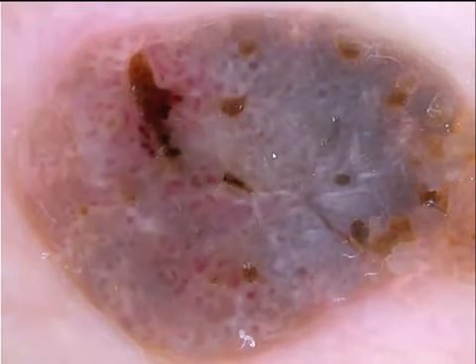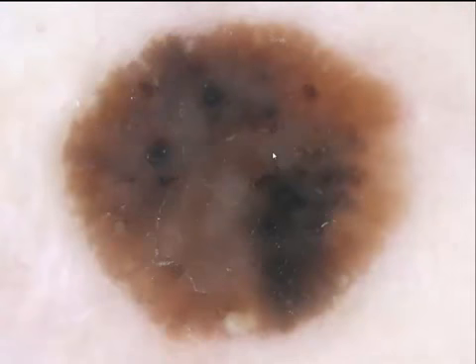This is a seborrheic keratosis. This is also a seborrheic keratosis, it's mainly structureless, but you see, what do you see? You see the clues to seborrheic keratosis, which are white clots, which are milia-like cysts, and again, black and brown and yellow clots that indicate the presence of seborrheic keratosis.